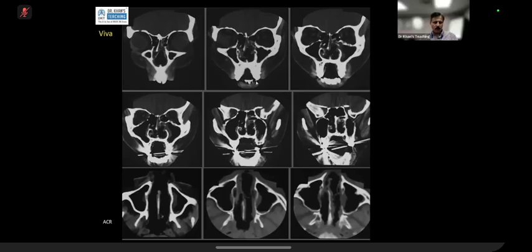Okay, let me take over. If you see here on this CT scan, what is happening is that the nasal septum is destroyed here, it's not present. Now, if you look carefully on this axial, again the same thing. There is crusting, we call it crusting, overlying this.